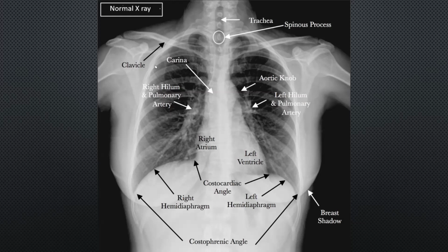So here, accurate or inaccurate? Not accurate. Why? There's no patient details. No patient information. Excellent. Adequate or inadequate? Adequate, because you can see the four borders. Up, you can see the cervical spines, and down you can see the diaphragm, right? And in the lateral, you can see the soft tissue. I think it's clear now in X-ray.